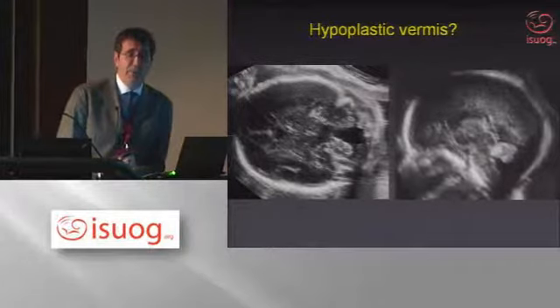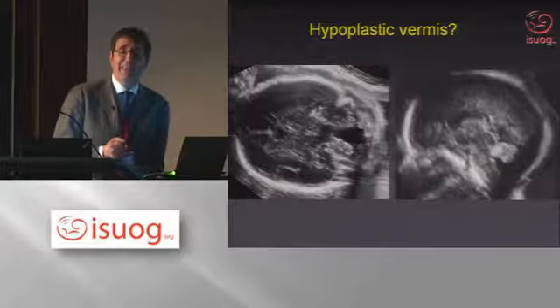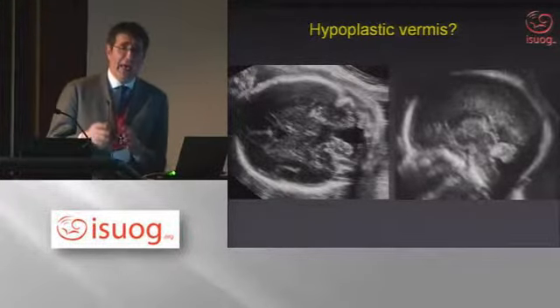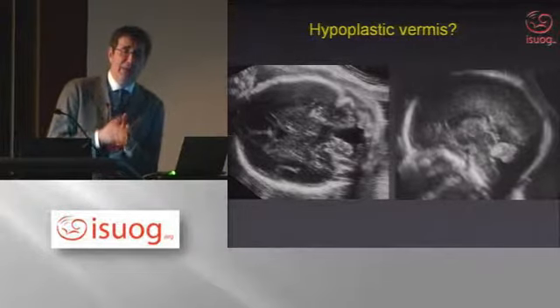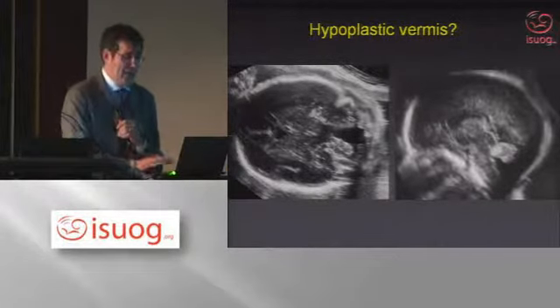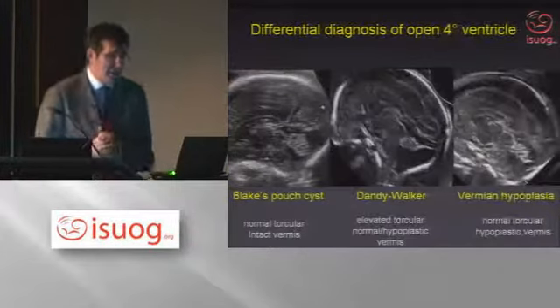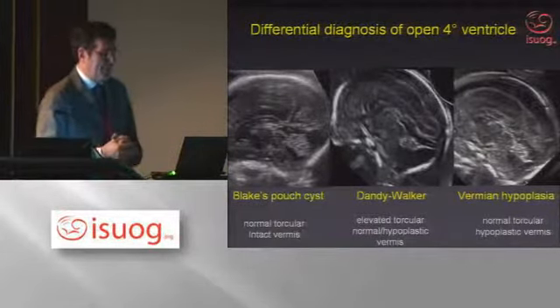If it is V-shaped, usually that implies either that the vermis is very small or that there is a significant degree of rotation, and both are not good prognostic factors. Again, it is very important to have the image in the sagittal plane, but that tells you a lot about the final prognostic significance of the single case.